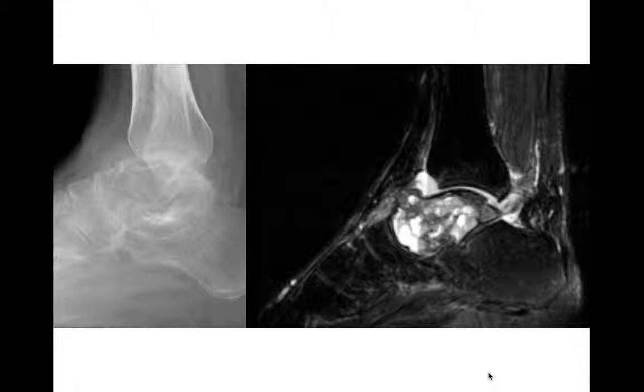And remember, for your differential diagnosis of fluid levels, giant cell tumor is on that list. Could this be an aneurysmal bone cyst? Sure, you can have an aneurysmal bone cyst here as well too. So you may be stuck between those two differentials in this case. This one turned out to be a giant cell tumor. You just remember your differential diagnosis for fluid levels on MR are going to include giant cell tumors, aneurysmal bone cysts, chondroblastomas, and telangiectatic osteosarcoma.